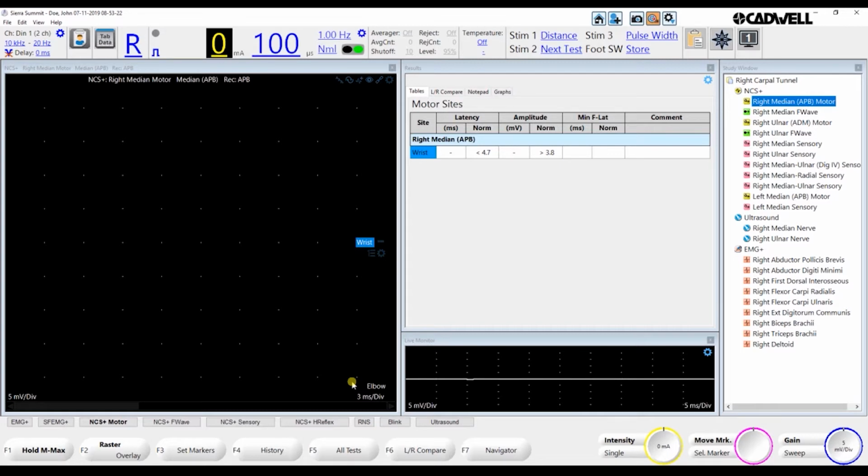When you look at your StimTroller, you'll see different buttons. You'll see ones that are labeled Stimulate and Store, and then you'll see buttons 1, 2, and 3, and then a plus minus button. The plus minus button just reverses the polarity from one side to the other, so the light is the cathode. The 1, 2, and 3 buttons are programmable, so that you can really use those however you want, so you can make the most out of the shortcut keys on the stimulator.